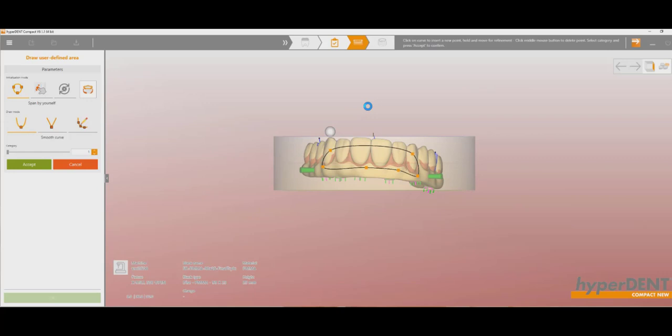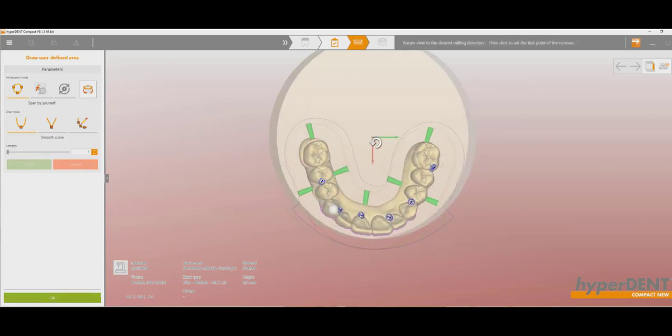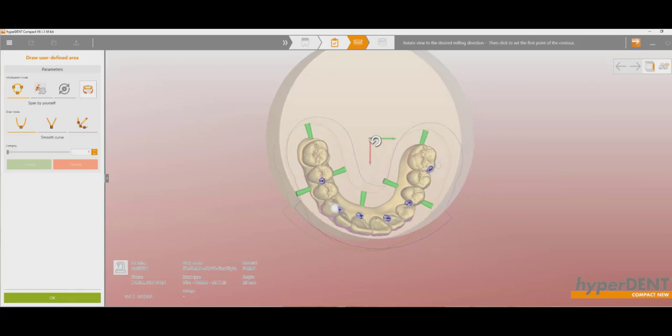I'm going to hold the right mouse button here and then rotate it. And we look down here on the left, this is 14 degrees. I believe it's about 17 degrees you're supposed to stay within. And then we're going to select 3 points here.